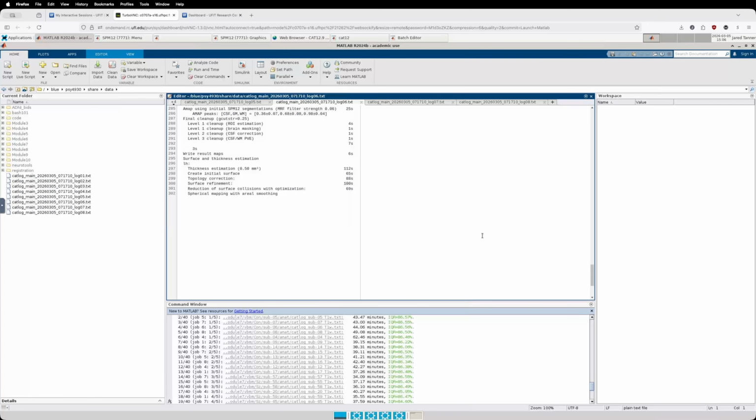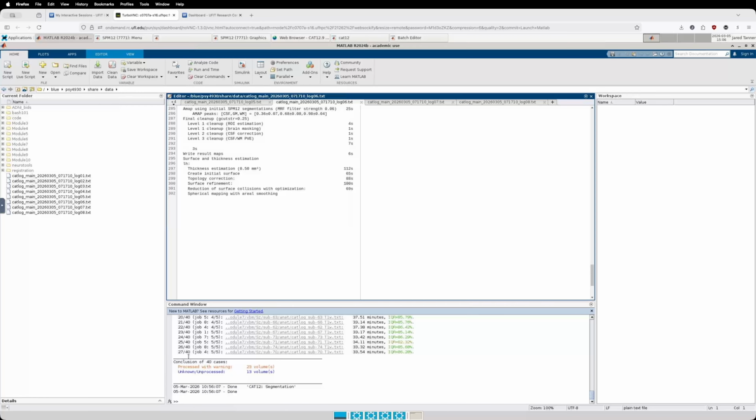And one last thing before I show you how to do it. If you did the processing and it shows 40 out of 40 jobs completed, all of this you can skip. You don't have to do any of this because it finished as expected. I only need to do this because we have some files that didn't process correctly.